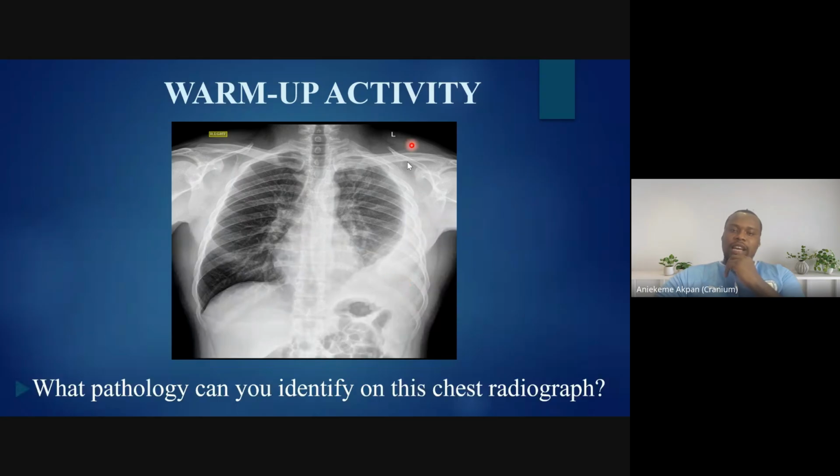So for us to say that there is pneumothorax, that means we should be seeing dark areas around the thorax, before we even talk about other features of pneumothorax, like you are not going to see lung markings within the area of that air, then you are going to see a pleural line.